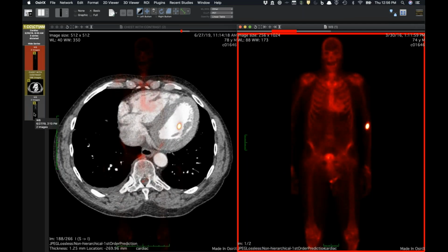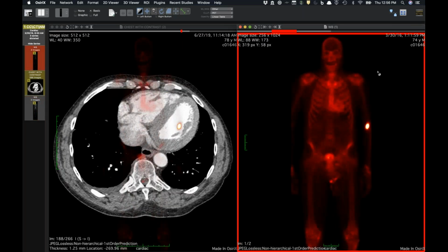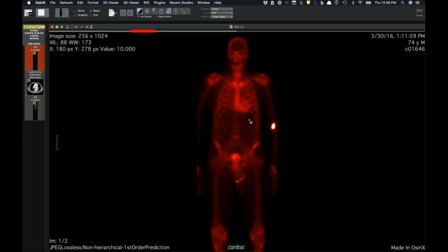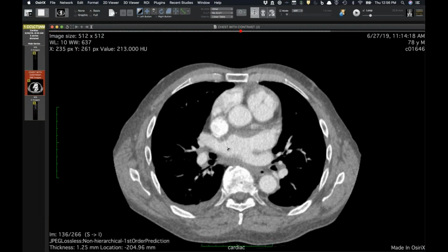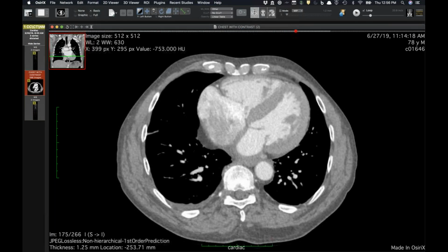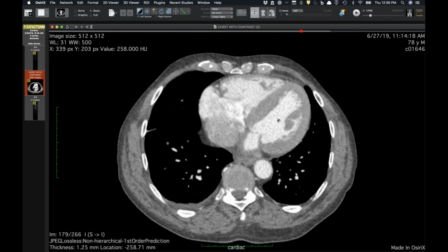And so this was actually called prospectively on a prior bone scan. This other bone scan looks the same over the course of them. But back in 2016, when the nuclear medicine people saw this, they suggested the possibility of this being due to cardiac amyloid deposition. And on the CT, they did a subsequent fat pad biopsy and confirmed that he has transthyretin amyloid. So he's got a little bit of diastolic dysfunction and small effusion.